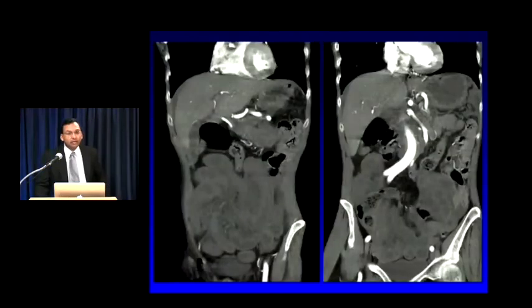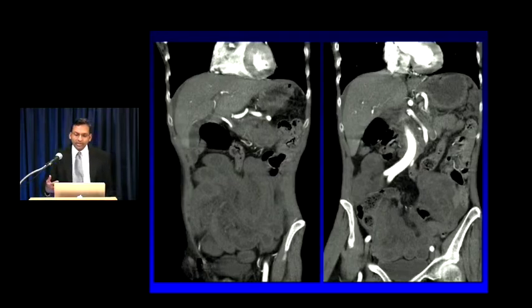So here's a great example of a patient who has diffusely ischemic bowel. And this can be tricky, and I showed this to a couple of residents, and they struggled because it's globally abnormal. And oftentimes it can be very difficult to figure out the absence of a finding rather than a positive finding. In this case, what you're looking for is the absence of enhancement. Notice how none of this bowel is enhancing at all.